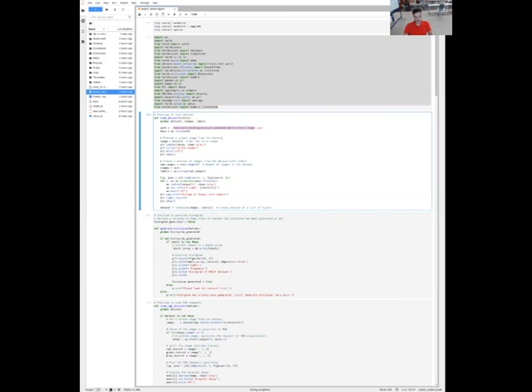The dataset is stored as a NumPy array where each element represents an image. Additionally, a montage of images with their corresponding labels is created and displayed to provide an overview of the dataset. By loading and visualizing the dataset, we gain insights into the images and their labels, which is crucial for understanding the data before further processing and analysis.